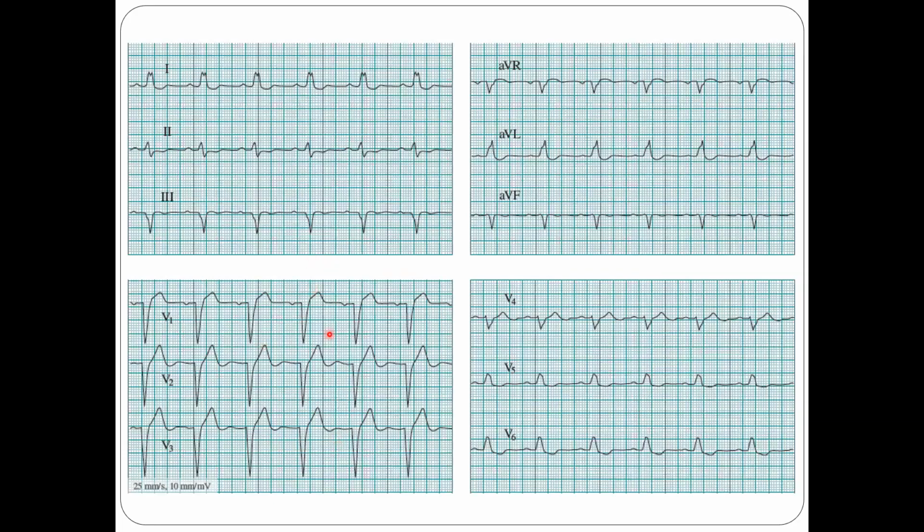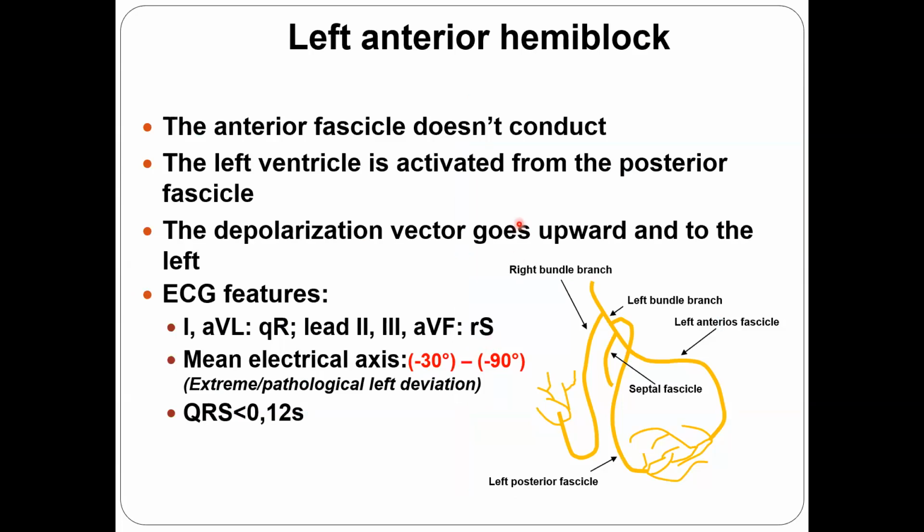It looks like everything that has a wide QRS looks like a ventricle rhythm. But first of all, how can we judge whether it's a ventricle rhythm or not? We do have a P wave and we do have a connection between the P and the QRS complex. And of course, the ST segment is altered, and that will cause some secondary ST changes. Any kind of muscle conduction is altering the repolarization phase, the ST-T segment. So you have to judge it. When we are talking about ischemia, you have to separate the conduction abnormality altered ST-T segment from the ischemia-caused ST-T alteration.